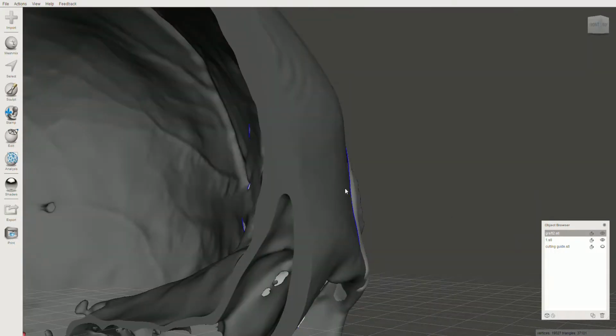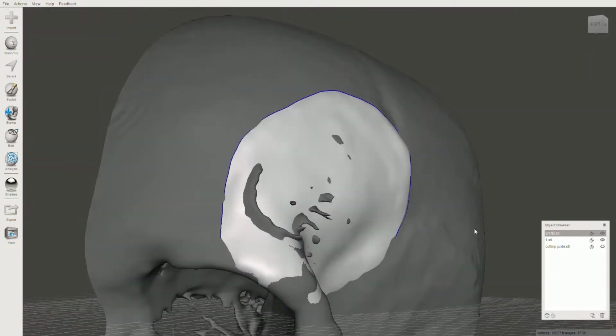Okay, now I can say that I am satisfied, and now I will export this part.